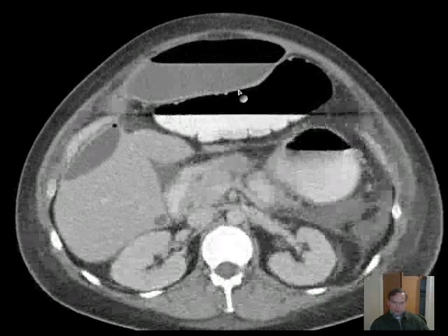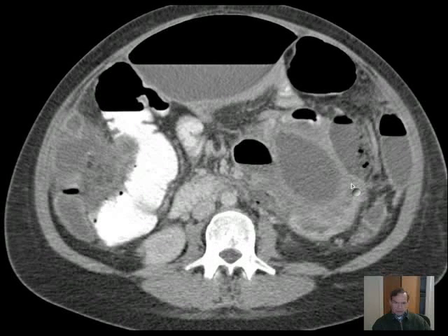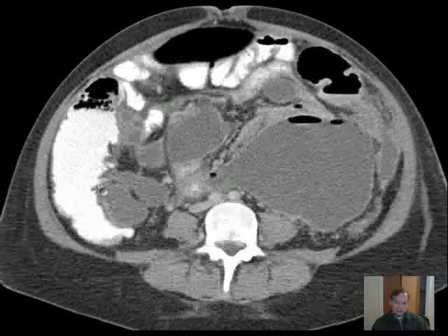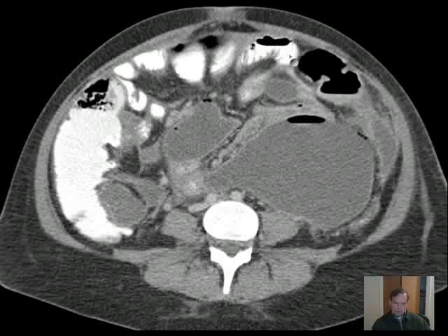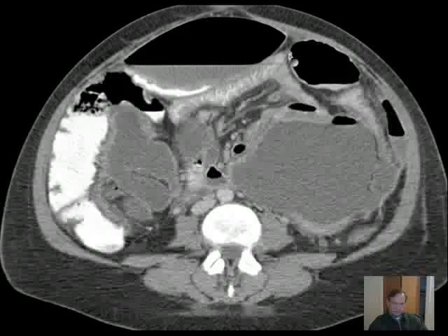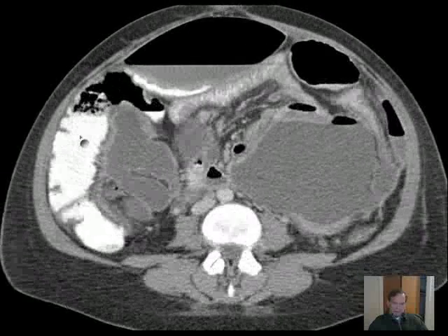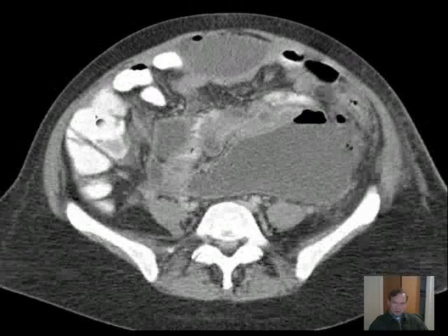So, how about the bowel? Well, the bowel looks abnormal, and we don't see very much in the way of normal appearing bowel loops, but we do have oral contrast filling some loops, and here you can see what looks like small bowel. You see the closely spaced folds in the small bowel of jejunum. Ileum has less of those. This looks like colon with some stool. Colon with stool. And this looks like cecum.